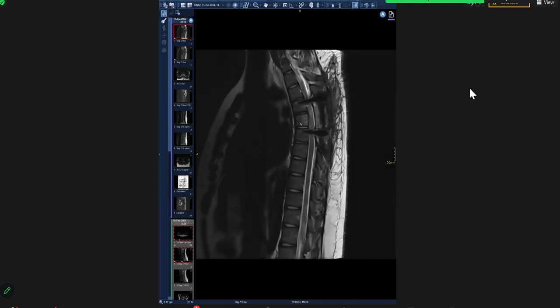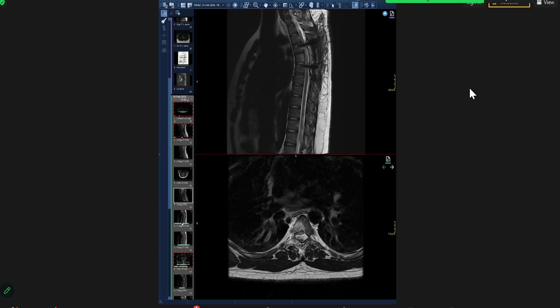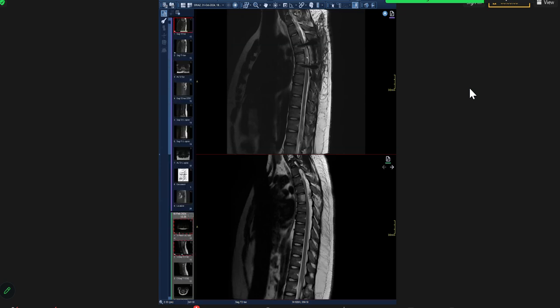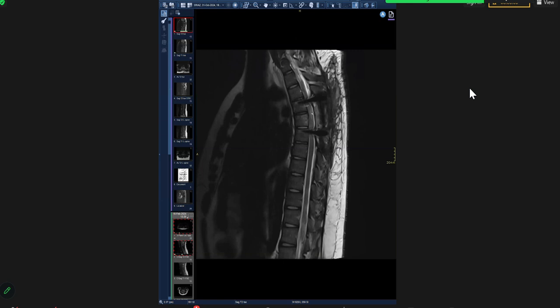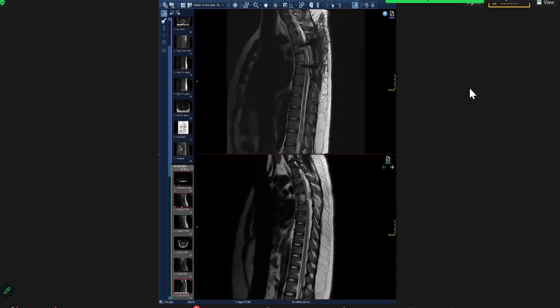You can still see that there are multiple small hemangiomas in the vertebral body, but the outside one within the canal is removed. Because the hemangioma is not malignant, it's not going to do anything to the patient. The only thing they need to do is this decompression really urgently. There's still some possible signal, but the cord has a relatively normal caliber here now, because they have decompressed it. So this was an aggressive hemangioma. Okay, so going to your last case, let me open that.